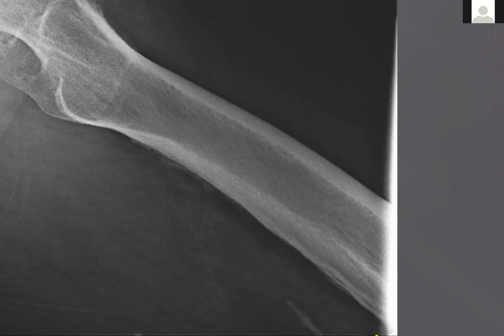Myositis ossificans. Good. I agree. This is probably a linear, intramuscular, right-along-the-muscle-fiber form of old myositis ossificans. So it might indicate that you do some Graston or ART or myofascial release.